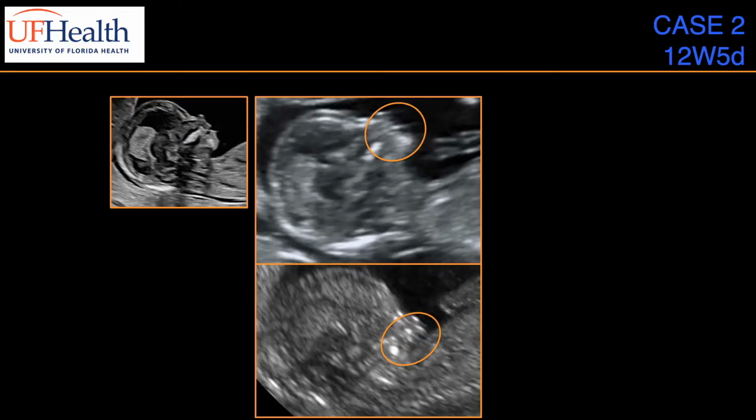And this will take us back to when we heard the talk about the fetal face and the role of the maxillary gap that was described by Professor Shawi. These are cases of cleft lip and palate suspected from the mid-sagittal view.